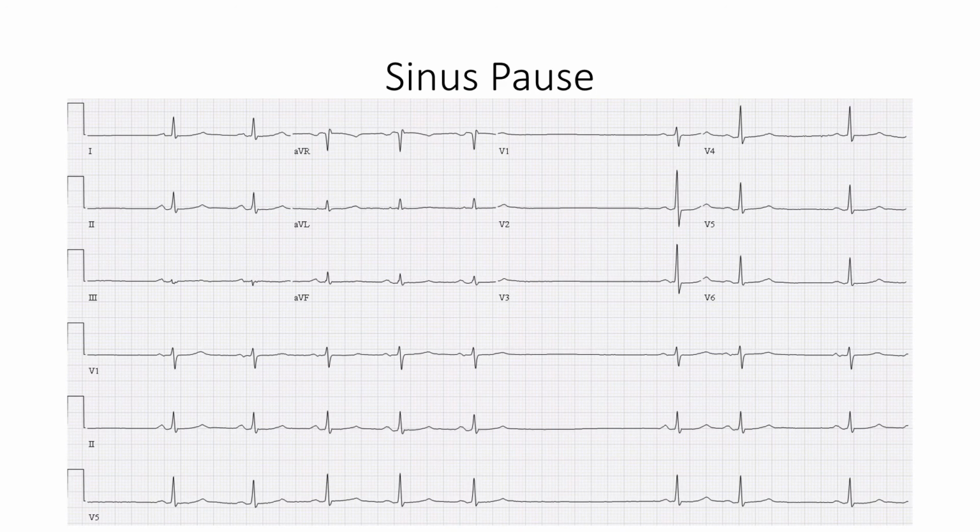So here's an ECG that shows a sinus pause, and this is syndromic of sick sinus syndrome, which commonly occurs in elderly patients when their sinus node begins to slow down. It can be a common cause of dizziness and syncope, or passing out, in the elderly who have sinus node dysfunction. And sometimes you can have a sinus pause related to obstructive sleep apnea or a carotid sinus massage and carotid sinus hypersensitivity. You can also see this in long QT pause-dependent ventricular tachycardia.